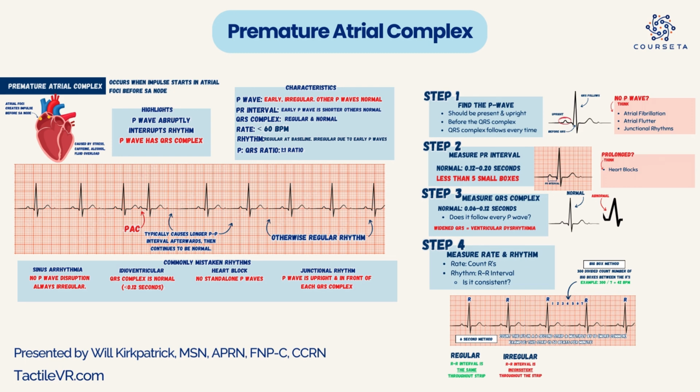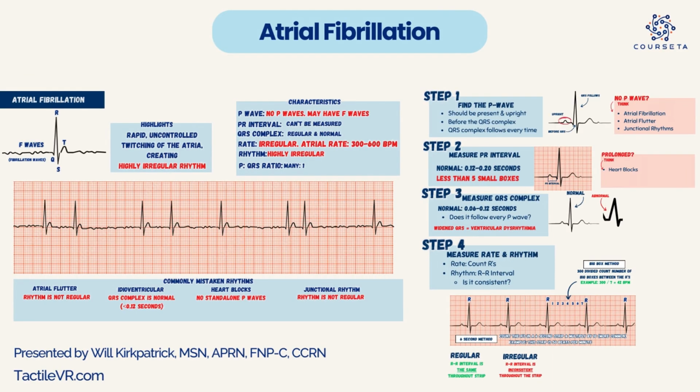Now, many people can get this confused with heart blocks, but the biggest thing here is heart blocks will have P waves without a QRS complex attached to it. This one is not the case here. The P wave still stimulates a QRS complex behind it, so they're still paired up, so this is not a heart block. All right, let's go over the infamous atrial fibrillation.